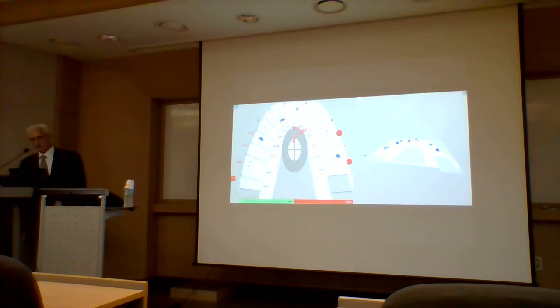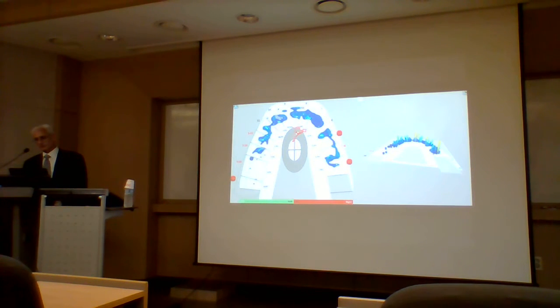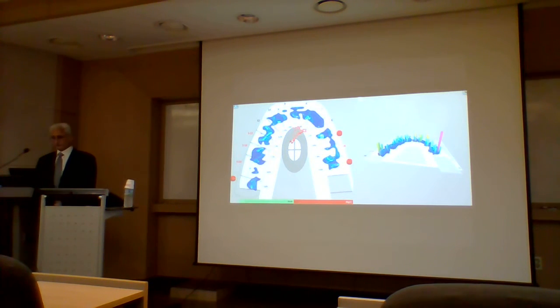You can see the anterior overload, then the right implants overload, and then the left implants come together. So the left side is actually in a pretty good time delay already. You can see what the time delay is.